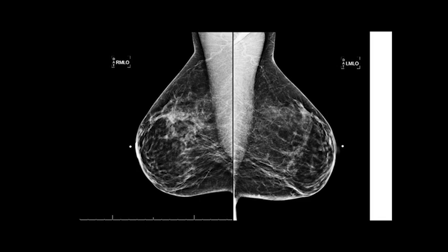That's just part of the process, and we do want to keep the dose as low as possible for our patients, but also we want to send in good accreditation images. So when I go do consultation, I'll say, no, we need to repeat this for accreditation. And usually the patient doesn't mind.